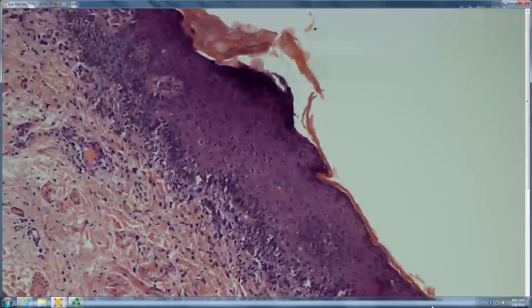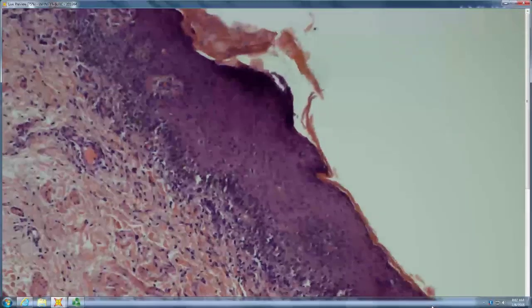The busy interstitial pattern in the dermis is very characteristic. It can occur anywhere on the body, but you often have gyrate or petaloid lesions in anogenital areas. So that's a common clue. Let's see.